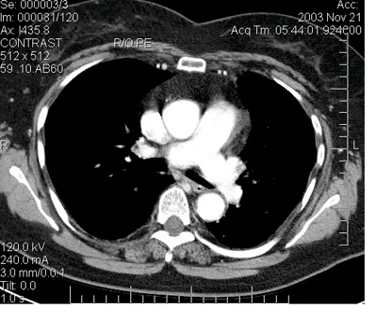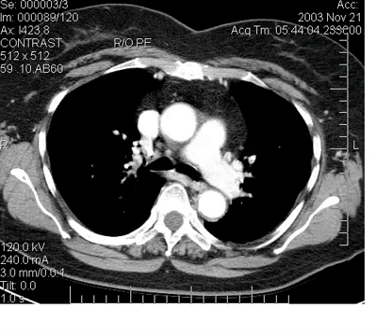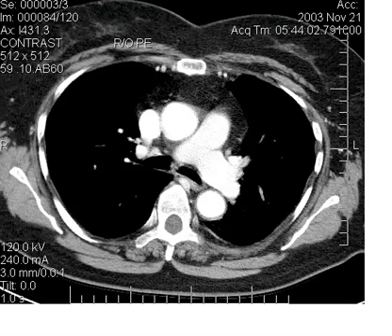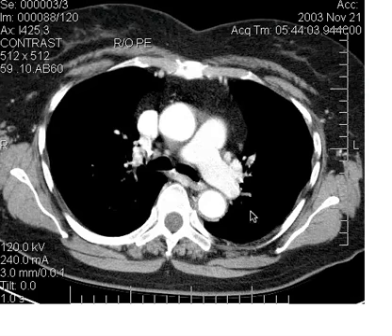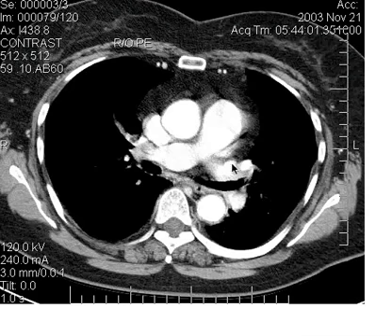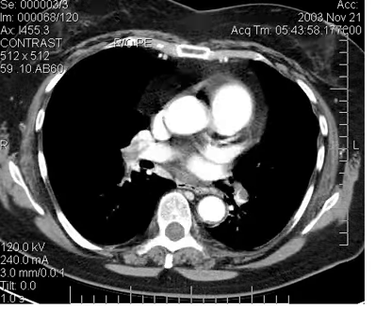Look at it and see if it pans out, following it up into the main pulmonary artery branches to that left upper lobe, and sure enough, you can see there's that little defect here, and then following it back down, you go back and forth, and here you see again that cylindrical or tubular character that most of these seem to have.